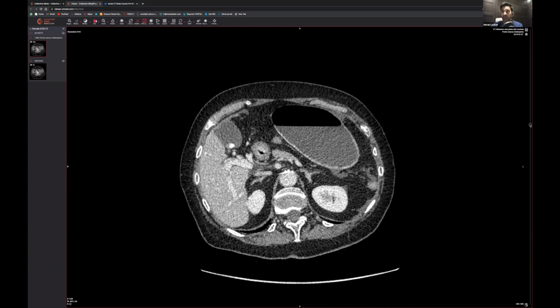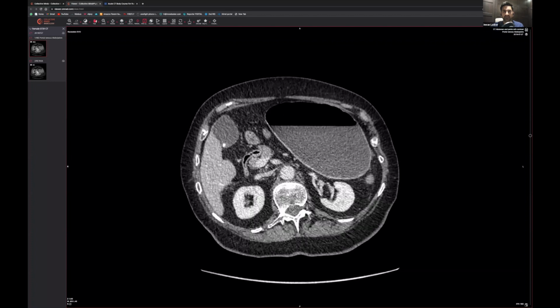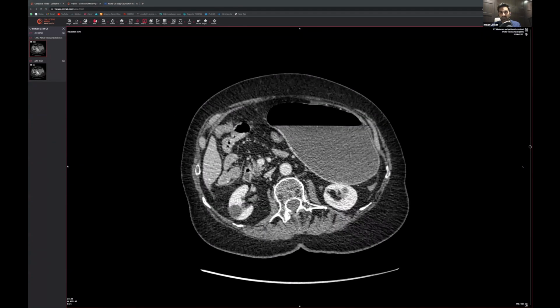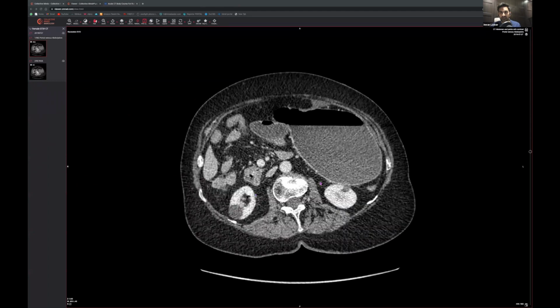The next cause for abdominal pain could be obstruction of the kidneys. So we're looking at the kidneys here, and you can see that actually they've still got a bit of fatty hilum in both, so they don't look like they're kind of backed up. And actually the ureters look very, very thin going this way and this way. So that's the ureter there, and that's the ureter there. They look very, very thin. Incidentally, there are a couple of simple cysts here, but again, nothing to worry about.